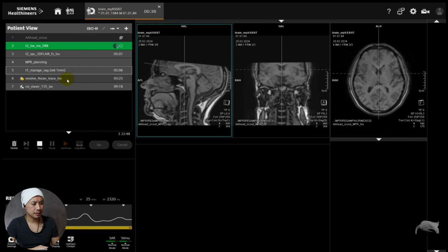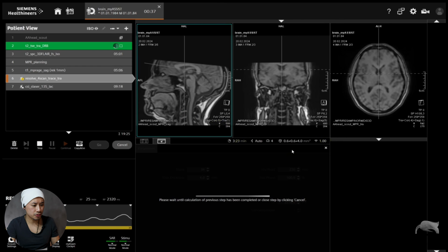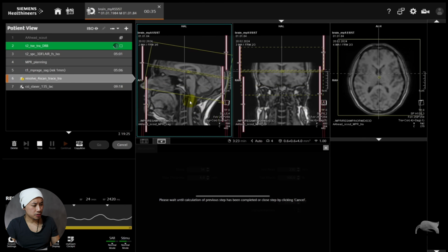Nothing opens automatically. For the diffusion as well. And also for the spectroscopy, it's the same way. We know that for spectroscopy, most of the time we want to have gadolinium images, so you can see where it's enhanced for the tumor or so before you put on the spectroscopy. And it really bothers that sometimes it just pops out automatically and you have to cancel, which is more interactions that are not needed.